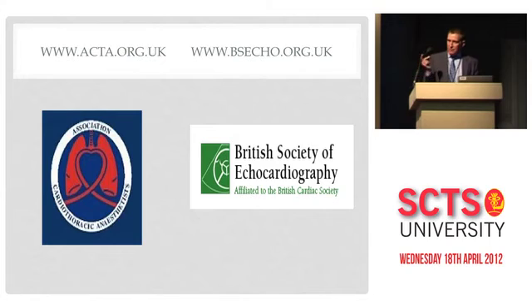Always take a picture of the left atrial appendage when you're doing your pre-bypass study, or in fact when you're doing any TOE study, because it may subsequently be required 7 days down the line in ICU or another context, and if you can show that there was no thrombus in the left atrial appendage, it is sometimes very useful information. So always take a picture and describe it in your report.